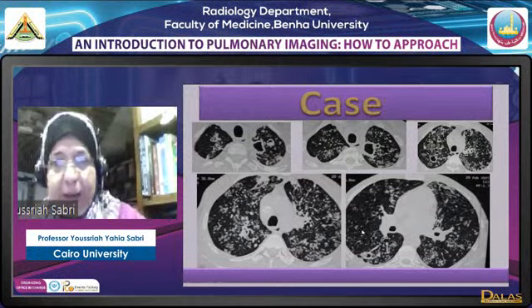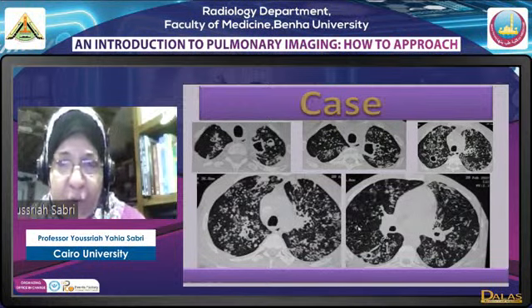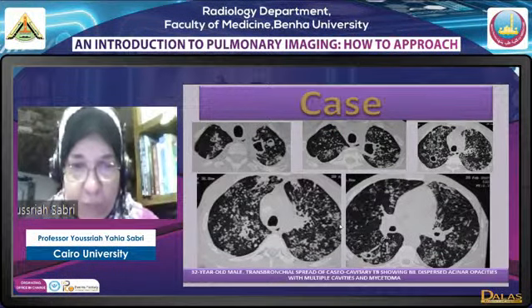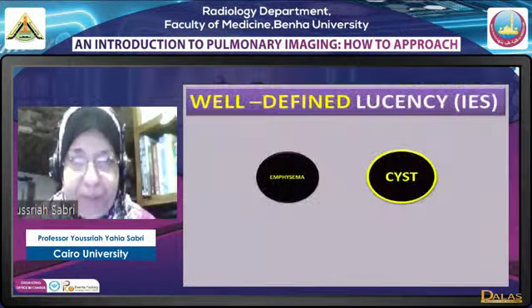And this is actually a case of tuberculosis with transbronchial spread and what we call tuberculous bronchopneumonia. These are acinar opacities, acinar nodules.